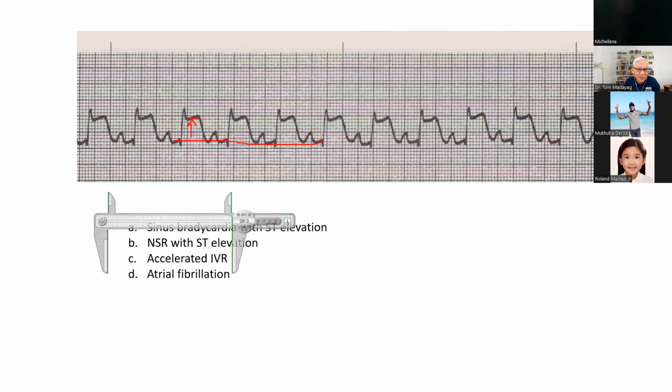Okay, so in this particular instance, we have a sinus rhythm, but there is an ST elevation that is an abnormality. And obviously, when you see this, it is going to be important that you obtain a 12-lead ECG. Now, I know that in the international arena where you practice, you probably need a physician's order to do a 12-lead ECG, correct?